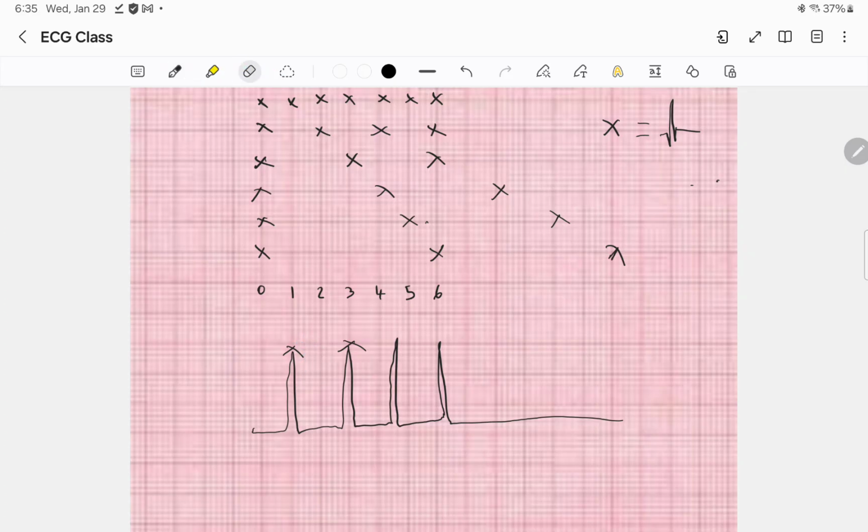Anyway, I digress. So what we're saying is you find 2 RRs or 2 QRS complexes that are adjacent, and you check how many large boxes are between them. And after doing so, you're going to divide 300 by that number.